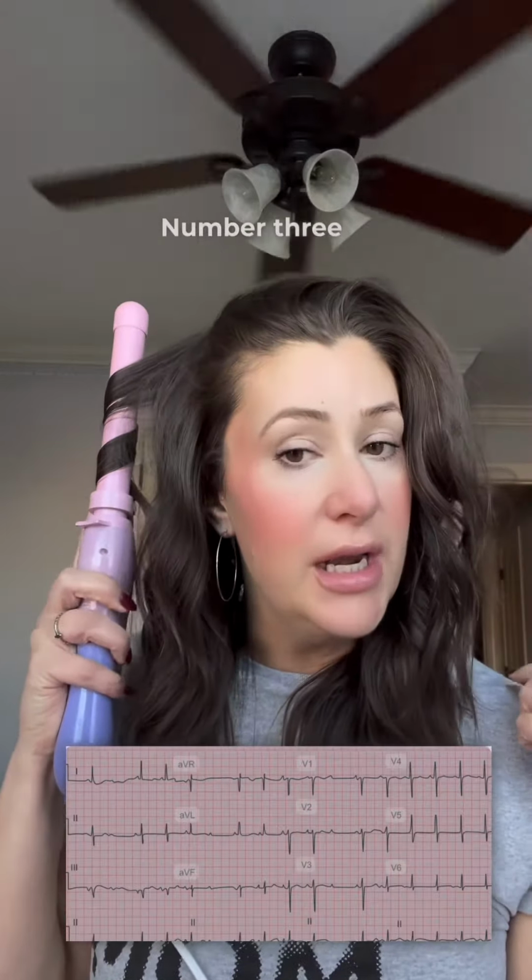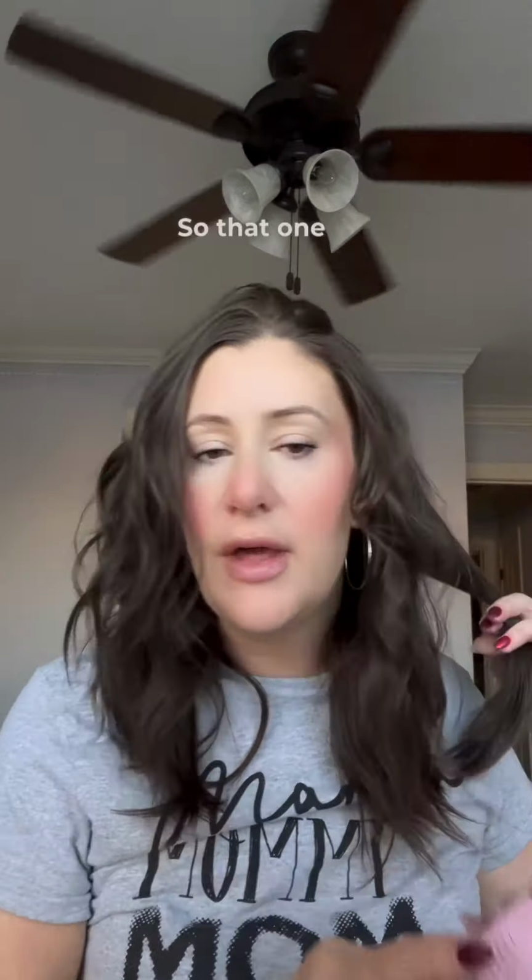Number 3, name this heart block. So that one was actually a 2nd degree AV block type 2. And what you'll notice about that, if you look closely, is that the PR interval remains constant.